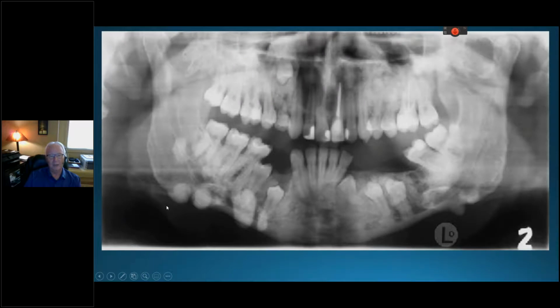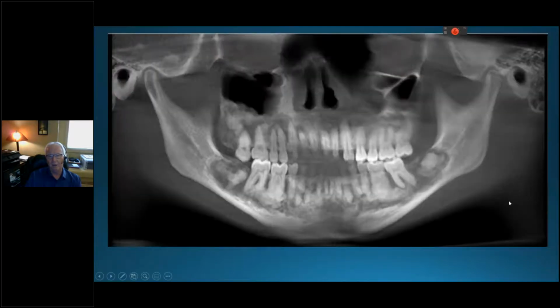I'll show you that now. You can see that some of these big radiopacities are outside of the mandible. They're not falling within the mandible itself. There's a lot of tooth problem because of lack of eruption and displacement of things, but this is more likely a Gardner syndrome, and Gardner's has a whole list of things that goes along with it, but the most important is these patients have intestinal polyposis that has a propensity to transform into malignancy in the colon. So if you saw this, yes, you do worry. If you saw this, just get a second opinion and don't worry too much.